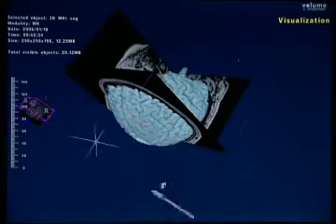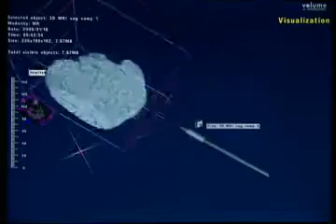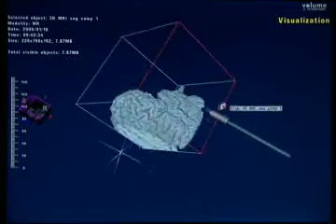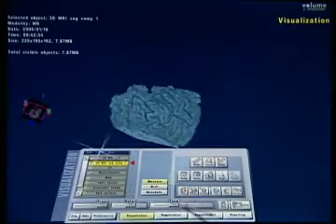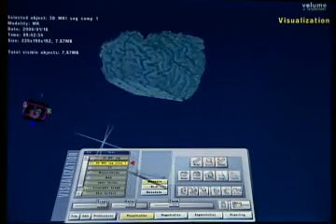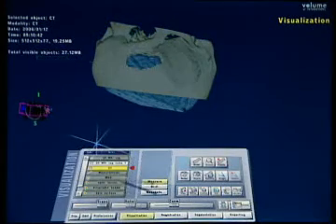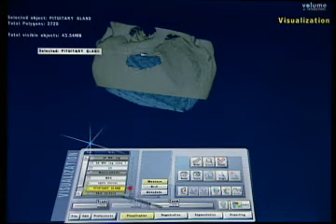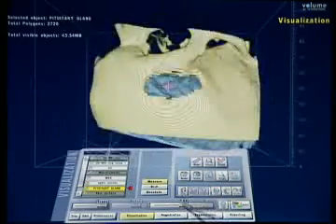So for the sake of, you see, this is the real thing now. No prepared stuff. This is how it works. So I'm cropping that a little bit for the sake of speed. And so this is the CT. And pituitary gland. Good. There is my frontal lobe.